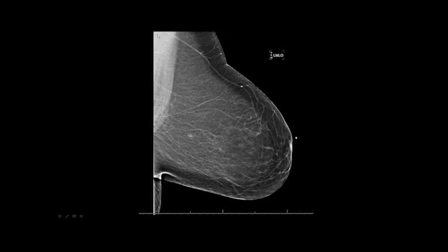Here's another good image. The muscle could be a little bit wider maybe, but it's a good muscle pattern. The bottom of the breast is horizontal, but there's a fold in the IMF. The IMF is on there, and the nipple's in profile. So this isn't bad, just a little bit of correction for this.